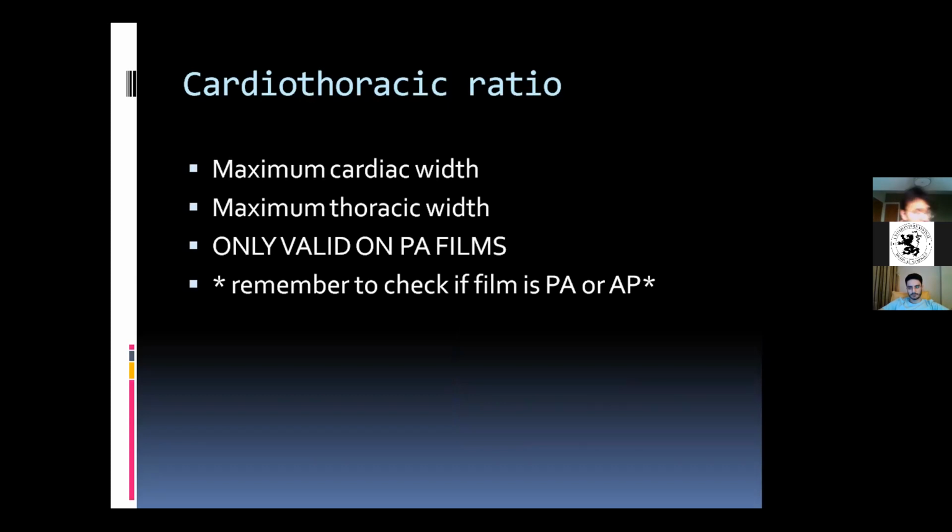There are so many cases, and this is something that a couple of my F1s have done as well. They just read the X-ray wrong and were suspecting cardiomegaly. We found out that the X-ray was done on a patient that couldn't make it to the X-ray department itself, and it was an AP view, and we cannot assess cardiomegaly like that.